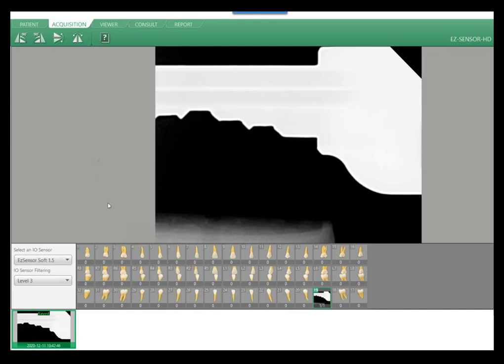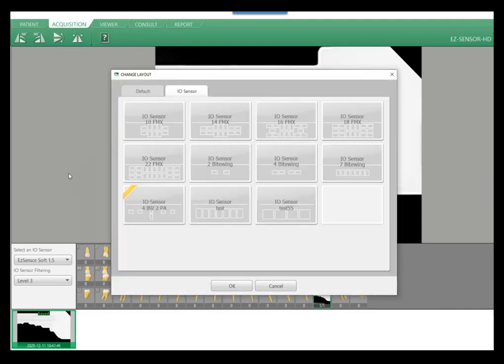All right, Paul, do I have any questions coming in or any comments on anything else I need to go through specifically through our acquisition of the sensor? Question about, let's see, it looks like just retakes in general, if you're in the mount, how to deal with if you're going from slide to slide, you want to maybe skip a slide or go back to, if you're in the middle of acquisition.